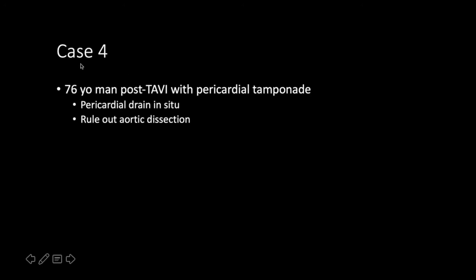Last case is a 76-year-old man post-TAVI who had pericardial tamponade. He had a pericardial drain placed and it was left in place, and they asked us to rule out aortic dissection.